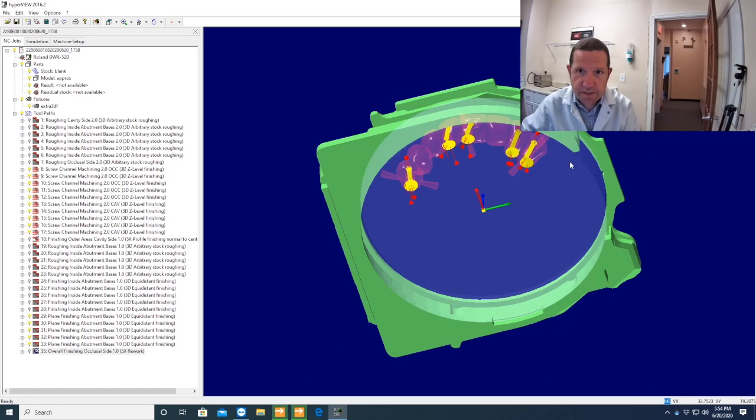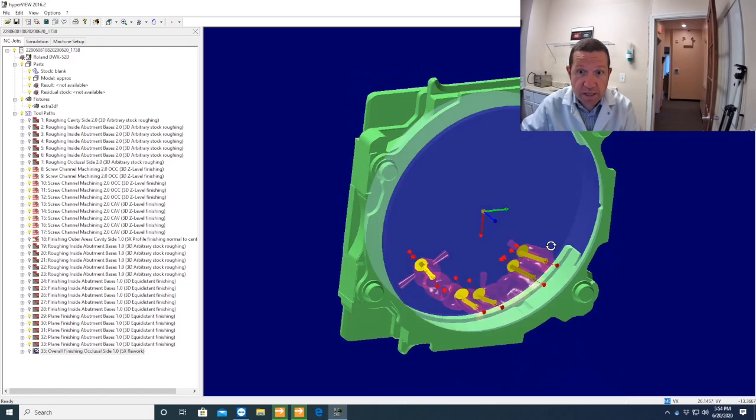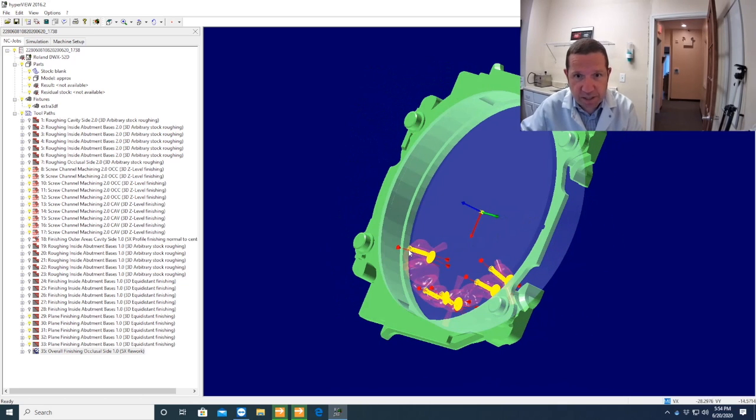As you can see, this is the abutment base that is being milled. This is the screw channel that is being milled. Sometimes, even if the job is calculated, the screw channels, especially when they are angulated screw channels, are not being milled. The software says it's going to mill, but it doesn't. The only accurate way to check is to show the toolpaths and check that these yellow channels are connected with the base of the coping.